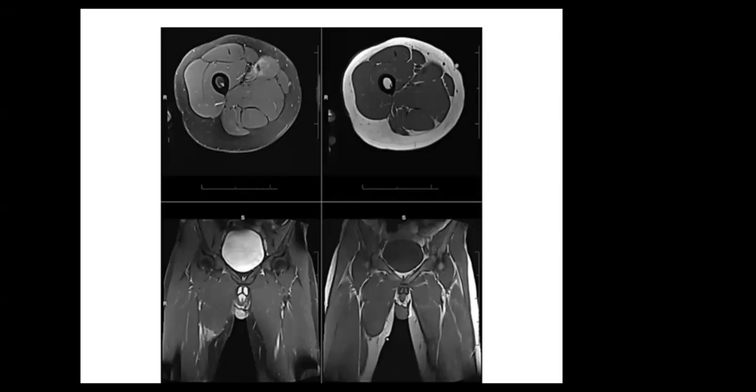No obvious gap, no obvious retraction. Just that. This is what I could see, Ustad: an abnormal signal intensity near the myotendinous junction, approximately.